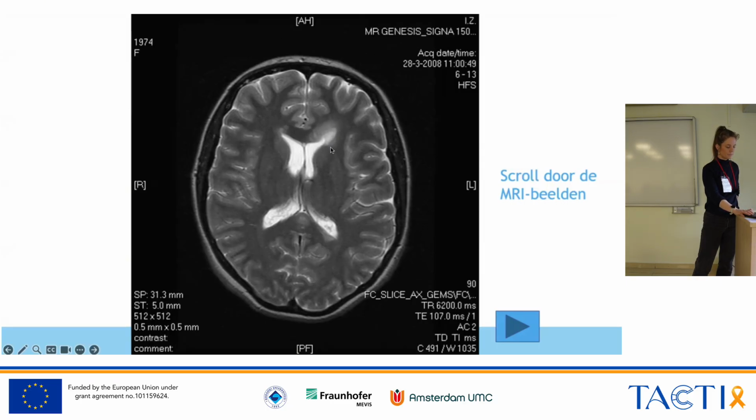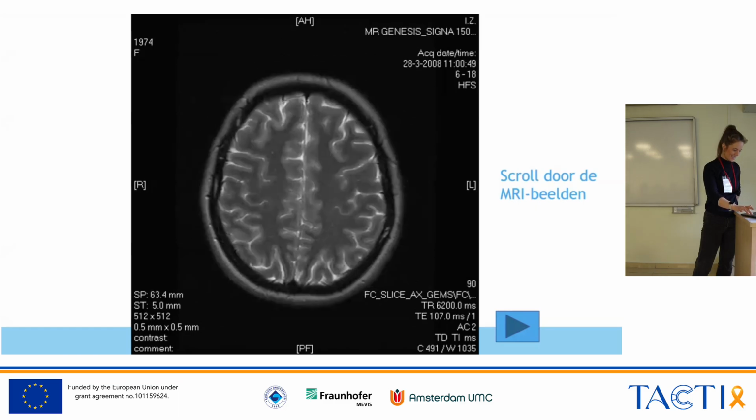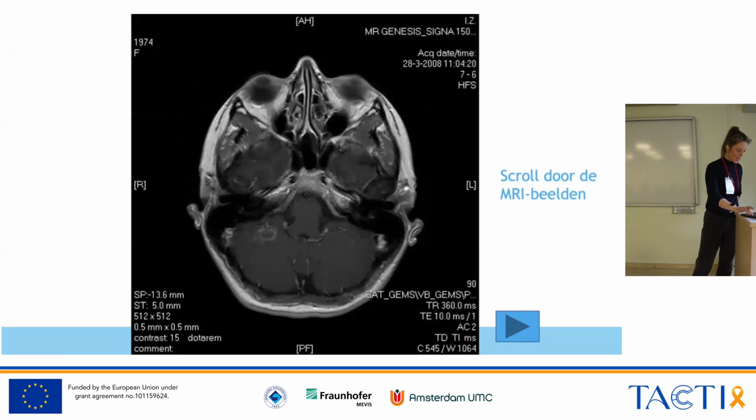For such a lesion, it might also be interesting to see the rim sign, the paramagnetic rim sign. Yeah, I agree. But this is 2008, so there was no SWI, no nothing. But what we had was gadolinium.